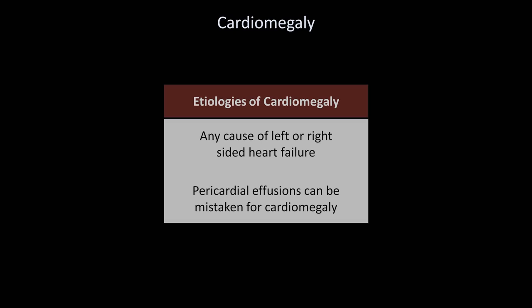As far as the etiologies of cardiomegaly, it can essentially be the consequence of any cause of left or right-sided heart failure. It's important to realize that pericardial effusions, which I'll discuss in a minute, can be indistinguishable from the cardiomegaly that's a consequence of an enlarged heart. While the finding of cardiomegaly concerns the heart as a whole, there are two cardiac chambers that can be identified as being enlarged on X-ray individually.